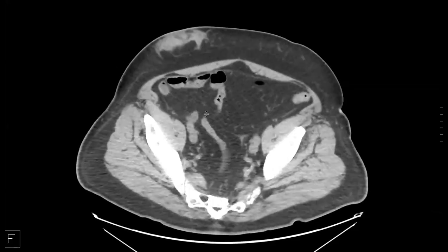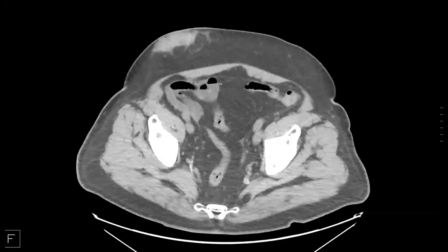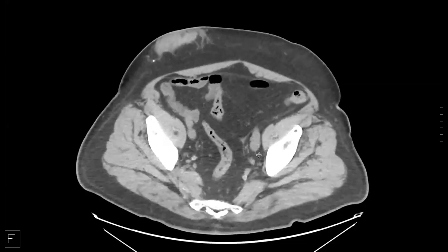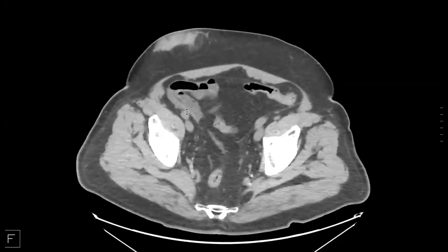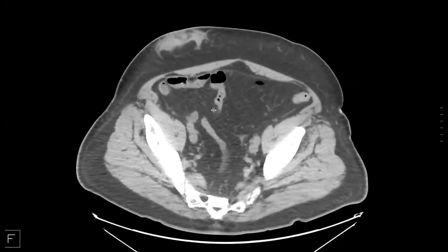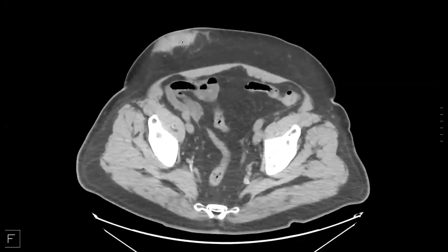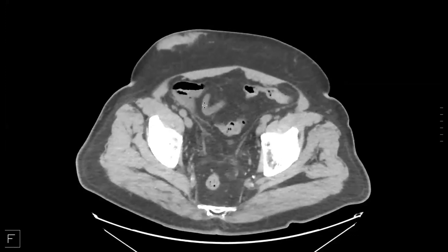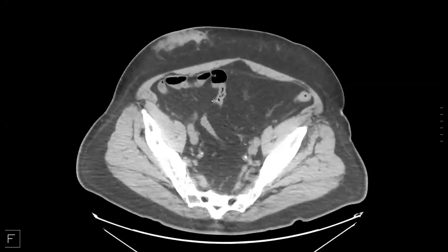Okay. So this is a patient with this finding here. Are they on an insulin pump? Well, they get insulin injections, and it's like the lipohypertrophy. Yes. They also call this the pseudo breast sign. It looks like breast tissue in the inter-abdominal wall at the site of insulin injection.